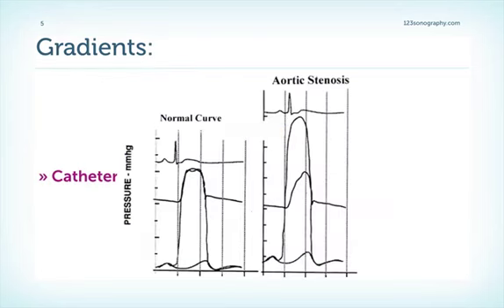So in the cath lab, we can directly measure the pressures in the left ventricle and in the aorta, either simultaneously or by pullback method of the catheter. These are the simultaneous tracings of the left ventricle. Look at the high pressure here, and in the aorta. Actually, the peak-to-peak gradient, what is frequently measured in the cath lab, is not a physiological or real measurement. It does not present the actual pressure of the left ventricle and aorta at the same time. And it's very important to consider that it is usually lower than the maximum or peak instantaneous gradient, which is measured by Doppler echo. Also, we can calculate a mean gradient in the cath lab.